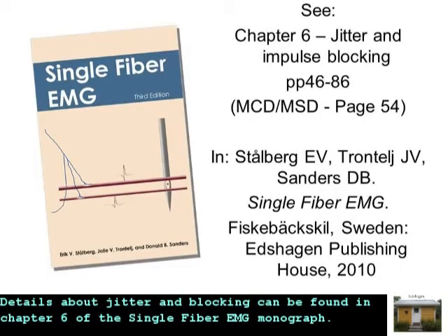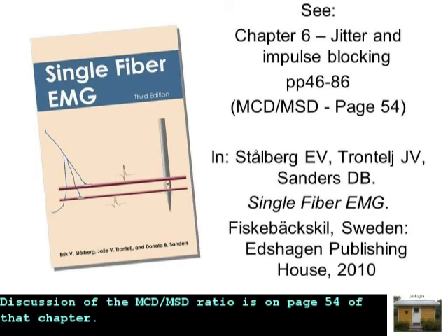Details about jitter and blocking can be found in Chapter 6 of the Single Fiber EMG monograph. A discussion of the MCD-MSD ratio is on page 54 of that chapter.